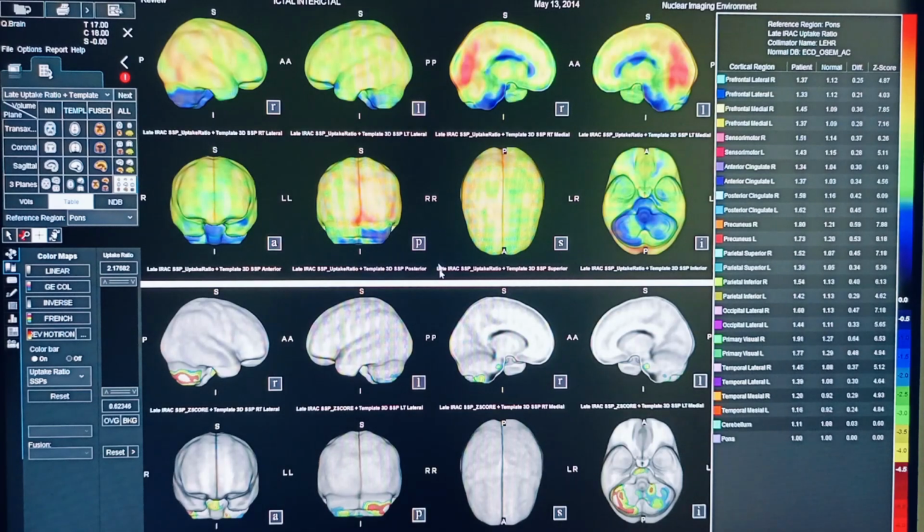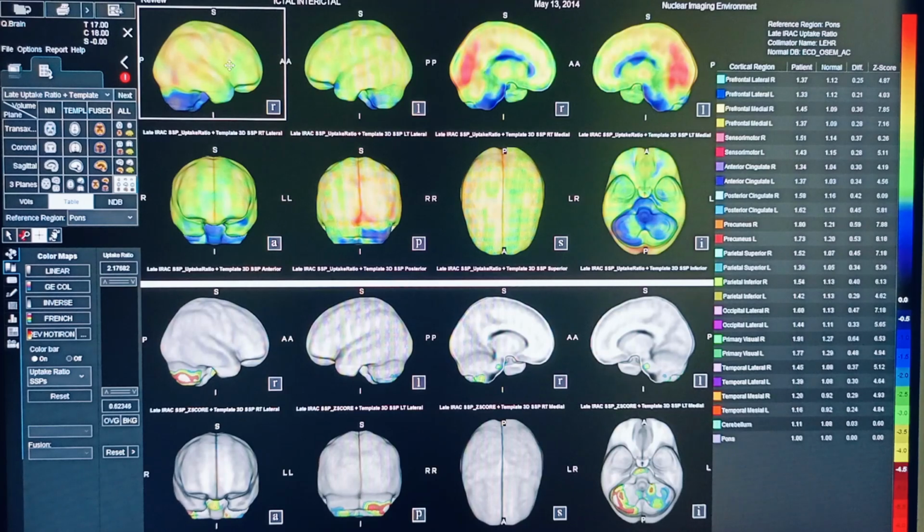Okay, so this image is very important for the interpretation. Like this image here, if you see the color scale, the red is like a good uptake. But if you see this color scale, the less number is on the top and the big number is below. That means it is a reverse scale. So a minus negative number represents hypometabolic areas. So these are the areas.